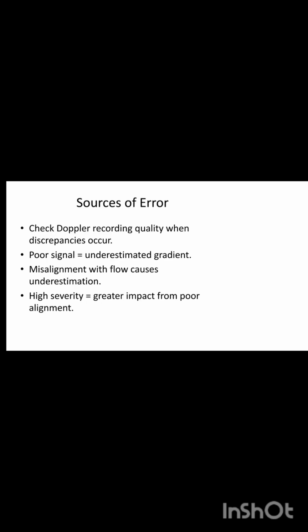A source of error is the Doppler recording, so check the Doppler recording quality when discrepancies occur. Poor signals underestimate the gradient. Misalignment with the flow causes underestimation, and high severity has a greater impact from poor alignment.